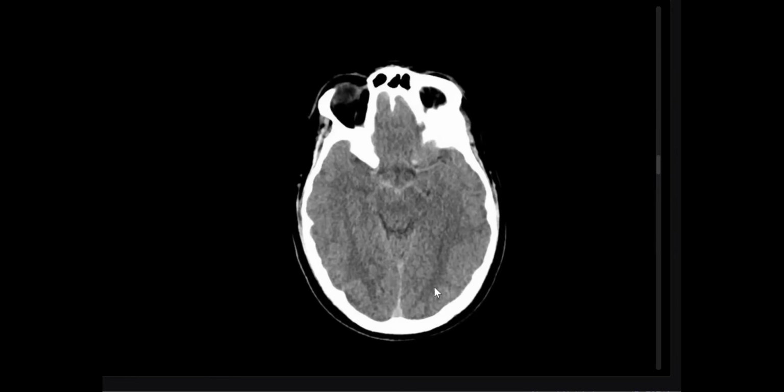So there is a perimesencephalic subarachnoid hemorrhage, and I do not see any large intraparenchymal hemorrhage or hemorrhage extending into the basal cisterns. Other basal cisterns, yes. Good. So I would be concerned the cause will be non-arterial, which in this case will be from the veins. How to be sure? So CT angiogram, yes, definitely. The next study will be CT angio.